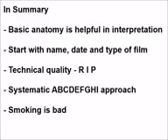Now that we've reached the end, it's time to summarise what you've learnt. A little bit of background anatomy goes a long way in interpreting chest X-rays. Start with the trivial stuff before diving into trying to diagnose the patient. Remember to comment on the technical quality using RIP. Use the A, B, C, D, E, F, G, H, I approach, and remember that smoking is bad for you.